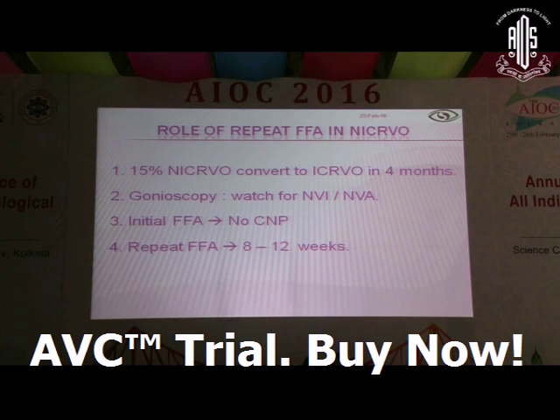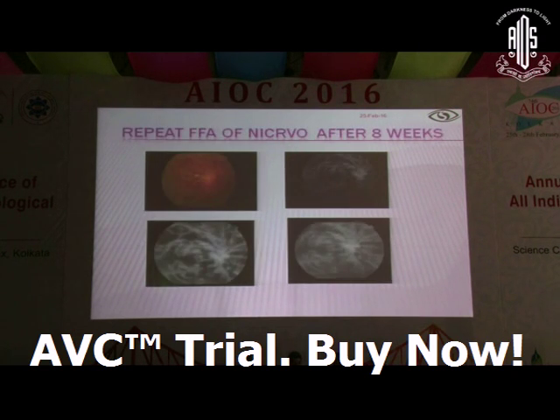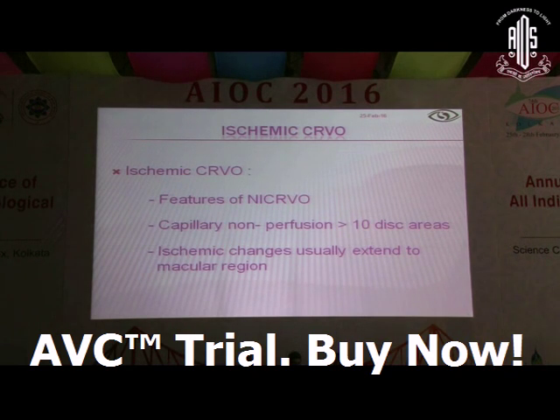But let me remind you here, the first angiogram in a central retinal vein occlusion or a BRVO will not be the final angiogram. In these cases, as we are aware, 15% of non-ischemic CRVOs get converted in 4 months into ischemic CRVOs, and thereby the role of repeat angiogram. As you see in this particular patient, we had done a fresh angiogram about 1 or 2 weeks following an episode, and he had an almost normal angiogram, so we didn't treat him. And 8 weeks down the line, he had a full-blown ischemic CRVO, and that is the role of repeat angiograms in cases of central retinal vein occlusion.